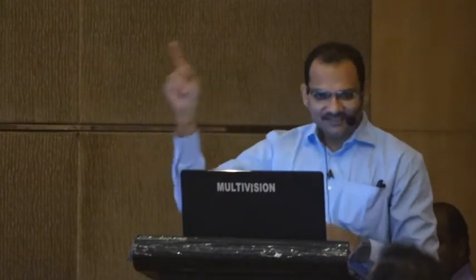Yes? Yes, very good. Bilateral pleural effusion. Tell it properly: bilateral pleural effusion, right more than left. Very good. This is the first abnormality. Second is a fracture of the transverse process of the vertebra, which we can miss. Usually we don't see it; we see only big structures. But if you follow the mnemonic A, B, C, D, E, don't forget to look at the bones like this. Anybody can miss it.